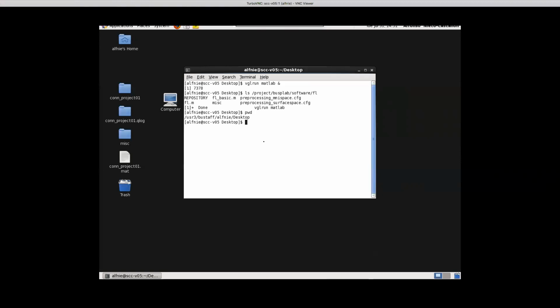So that's, at least in terms of the labeling, been going on behind the scenes. Right, exactly. All of this is happening behind the scenes. Basically, the surface level information is just a nuisance: it's just a product of how FreeSurfer actually computes those surfaces, with a different number of vertices per subject.